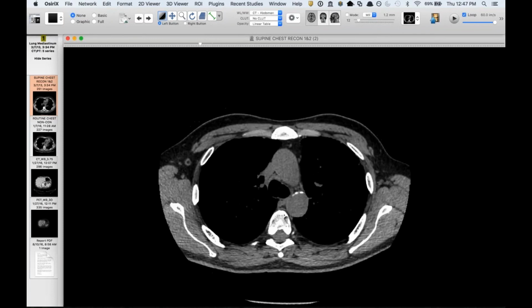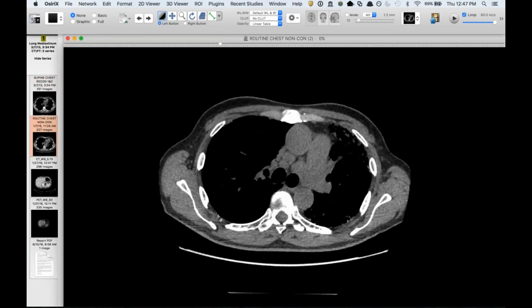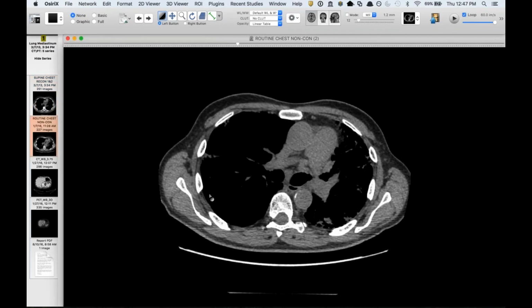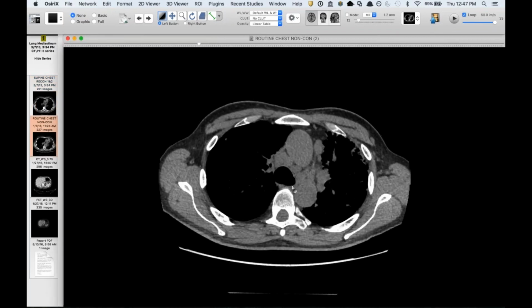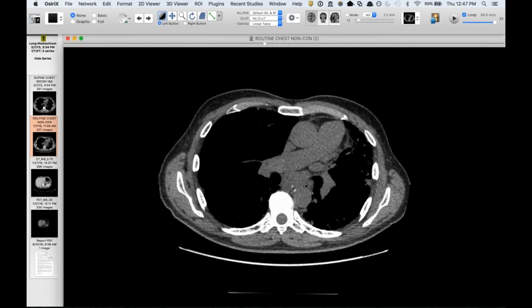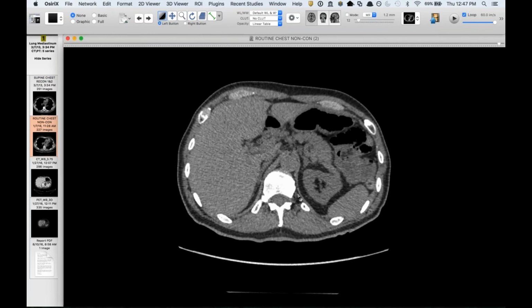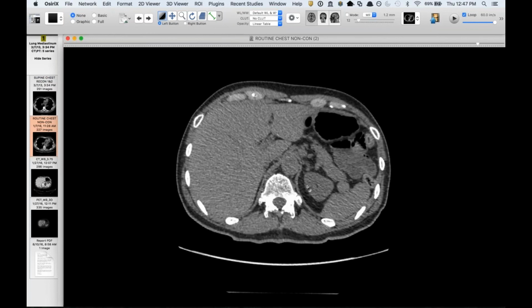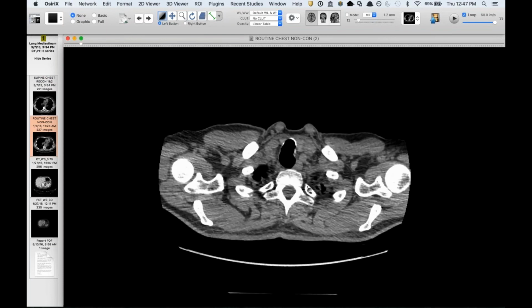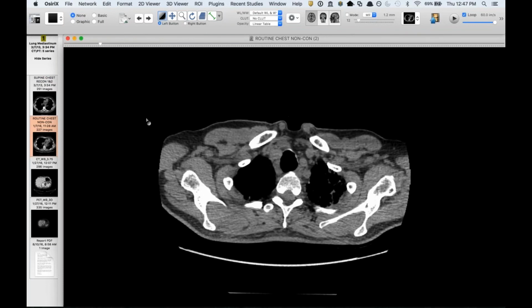And pay attention to the mediastinum here. There's maybe one lymph node, which we see all the time. But here he was in January 2016, and you can see he's got pretty bulky lymphadenopathy throughout his mediastinum, and even down into his upper abdomen. He had some nodes in the portohepatis, and then up in his neck too. He had some supraclavicular nodes, which I don't think we can see on here.